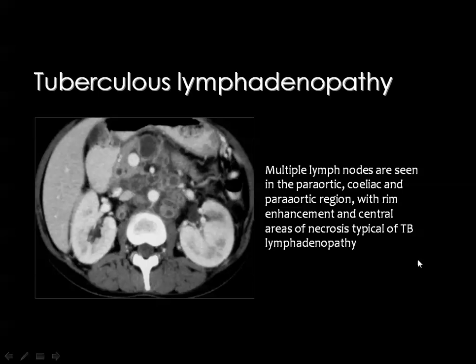You know that this is the superior mesenteric artery, and this is the superior mesenteric vein, this is the pancreatic head, and this is the common bile duct, and this is the common pancreatic duct.